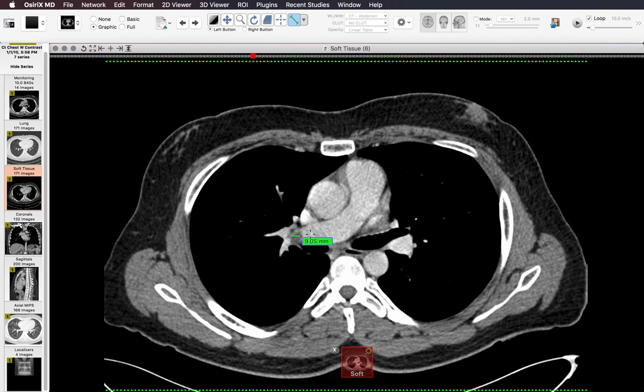And that's okay. Like this lymph node is 9 millimeters, and that's okay. Usually that lymph node is about that size, and if you don't see any other abnormalities in the mediastinum, like no other enlarged lymph nodes, and you don't see anything in the lung that can be causing lymph node enlargement in that right hilum, then I would just ignore that finding, because I've learned from experience that that lymph node is just normally 9 to 10 millimeters in size.